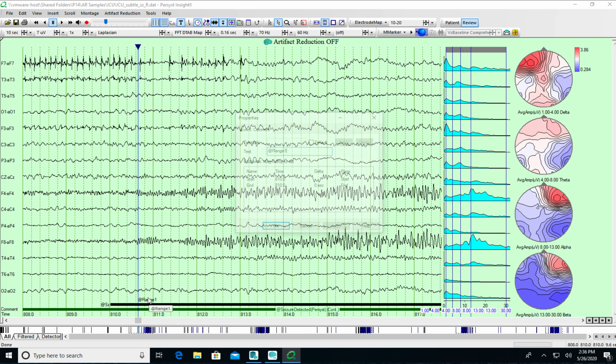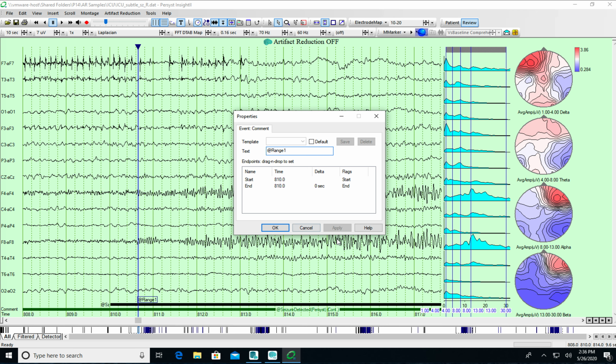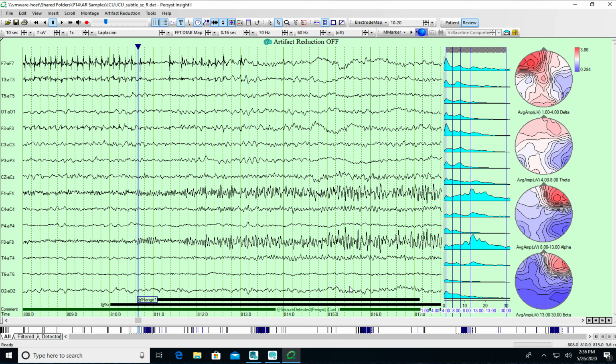So I'm going to double click on this. And I'm going to click on the word end and drag it onto the page. And see, now I've created a 6-second comment. Click OK.